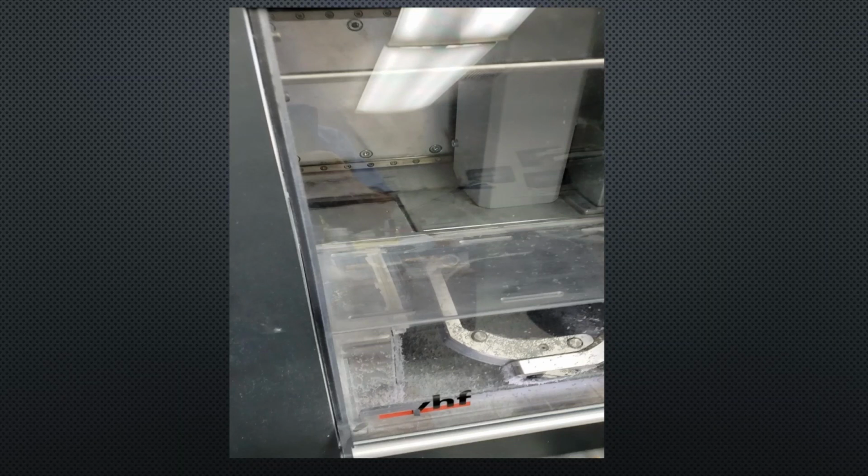Really remember that this is eventually going to be a nice little flexible piece of material, an appliance. But while it's milling, we want it to be rigid and solid. I try to save up 2 cases so I can position them in the puck together so they support each other, but I can't always do that. In fact, in that instance, I think that was the 3rd partial I had snuck into that puck. And that'll happen. Most of the time you'll get 2 out of it, but every once in a while, with a small partial, you'll be able to sneak a 3rd one in.